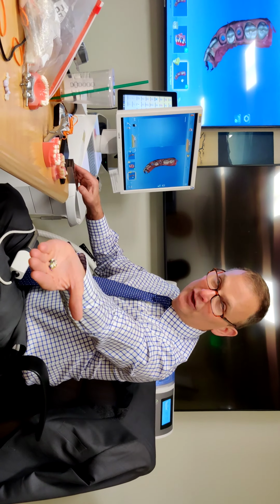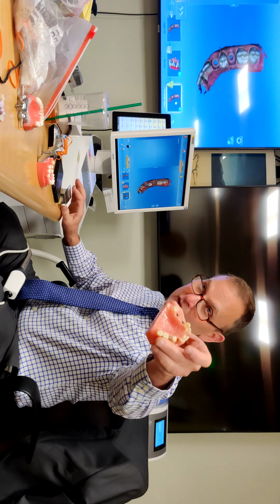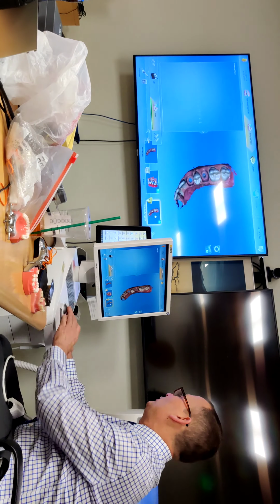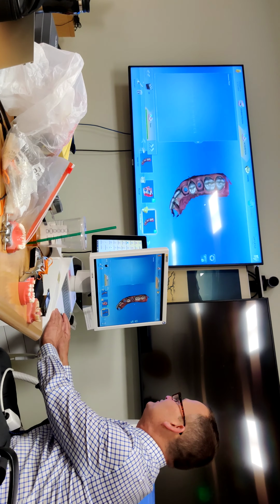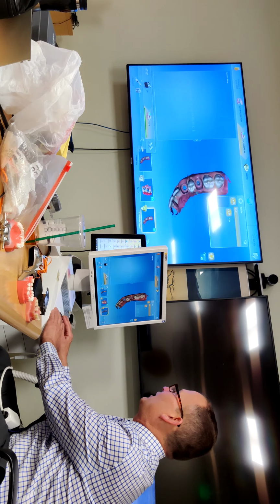See those pretty jewel tones? You're welcome to look at these. This model, everything's 4.2, okay? So we've put it in. Now look, I'm doing 13. So to save time, I've copied it in. Now I'm going to come here. I'm going to cut this out.